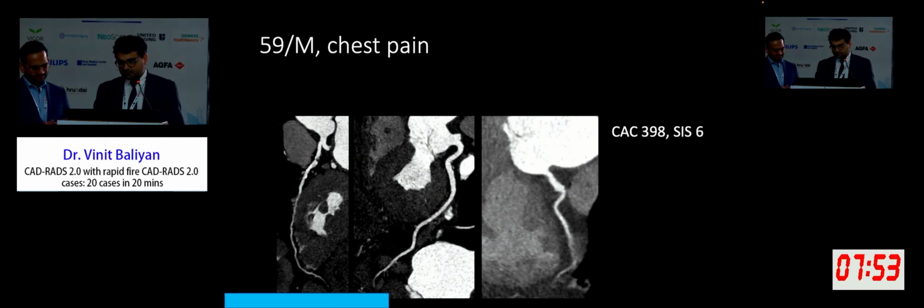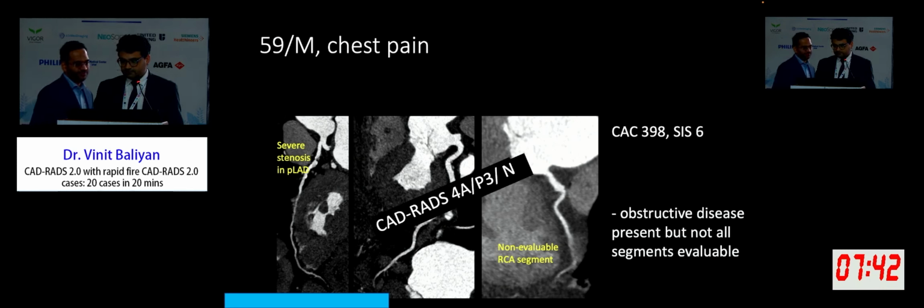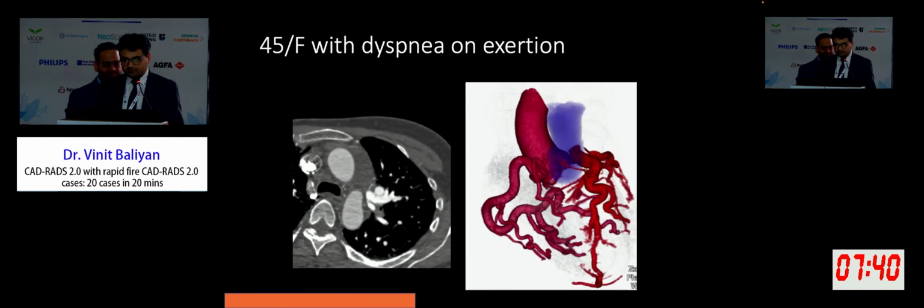So in this case, looking at that LAD, it looks like a 4. So 4A and a P3 and modifier N. Alright?